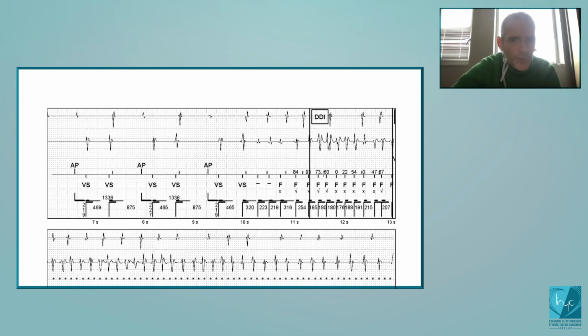And you see an example here. On the old ones, the functioning of the morphology was not so good. And you see, for example, that there is a relation with the reference, and it's obviously different, and this is obviously a tachycardia. But when we discuss the discrimination, I will explain to you how it works now for the morphology, and it has been considerably modified.